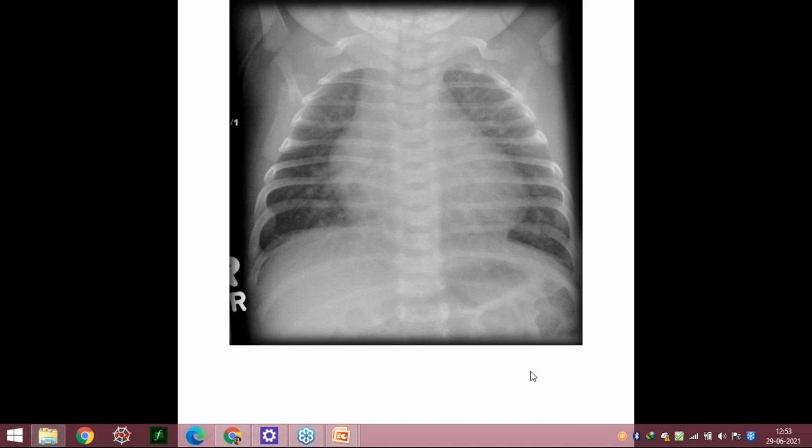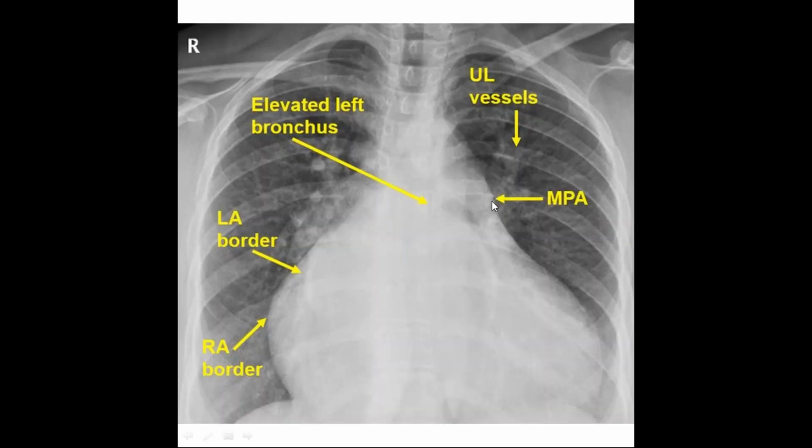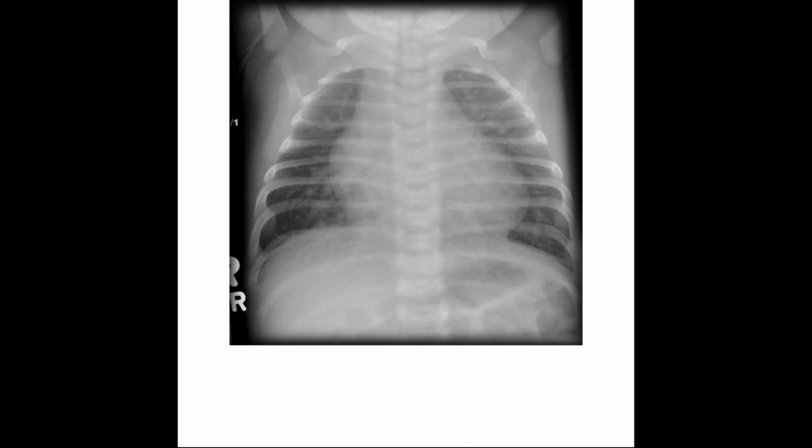So these are the X-rays I just want to put forward for you guys to have a view. Okay, so next, now see. This is an X-ray that I found online regarding the classical description of mitral stenosis. Pushkal, it is not necessarily that this is a TGA, like one of you mentioned. As I have been saying in my whole class, do not jump to the diagnosis right away. Always describe what you're seeing on the X-ray. If the examiner asks what is the possible diagnosis, you can put forward the diagnosis.